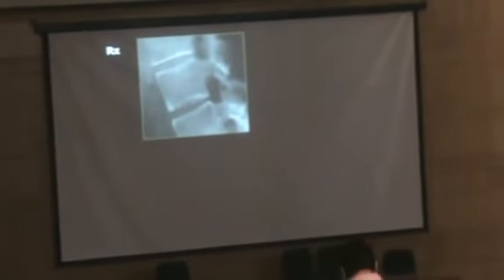So I'll show you some examples of that. Here we can see in the early stage very mild changes in the anterior corners, probably referring to Romanus lesions. The square vertebral body we can see as well, but not a lot of syndesmophyte formation here. Here we can see some syndesmophyte formation at a very early stage. I think everyone can see it here with the square vertebral bodies.